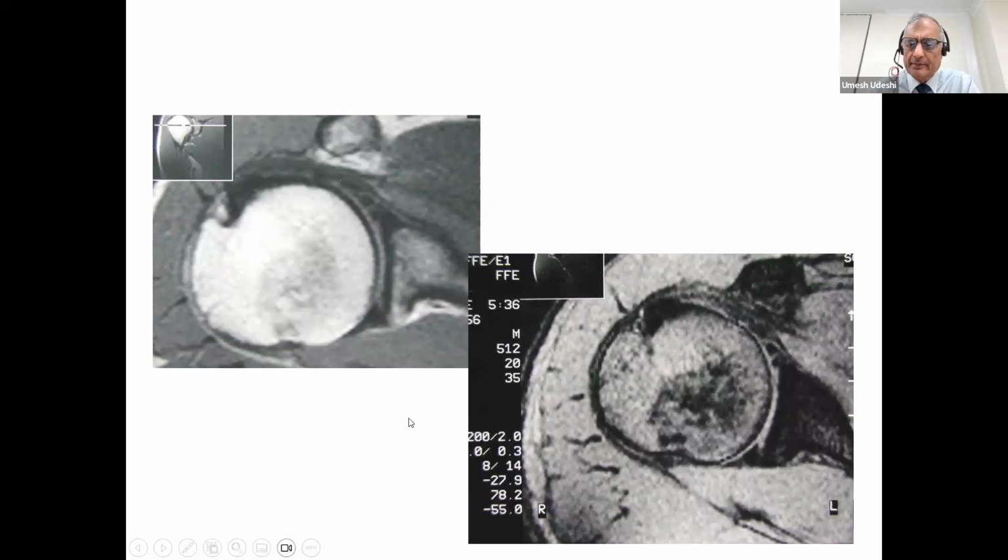And here's two examples of the same patient where the anterior triangle is there, but there's this higher signal going through this bit of the anterior labrum, and you can see it there again. So that's a labral tear demonstrated on a standard shoulder MRI scan without arthrography. It's just a little bit more difficult to be absolutely 100% certain, particularly in elderly patients where you will get degenerative signal changes in the labrum. And I like to be absolutely sure before I tell a surgeon that there's a labral tear.